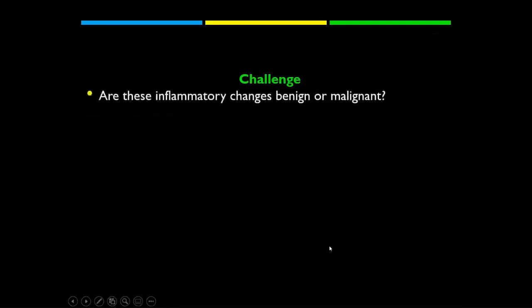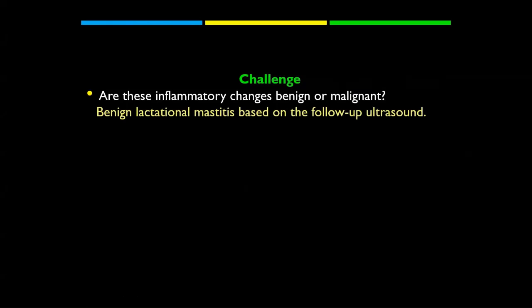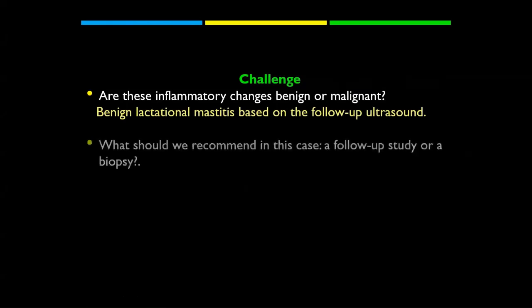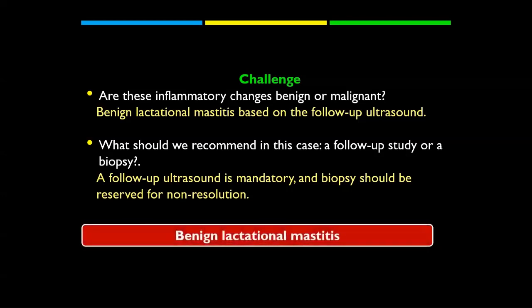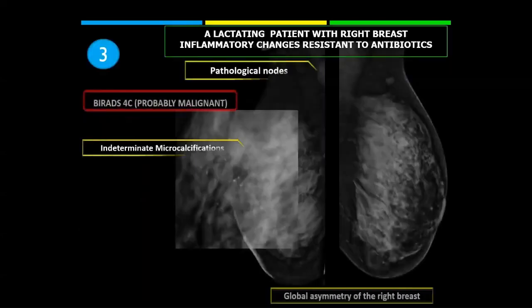So the challenges in this case, are these inflammatory changes benign or malignant? We cannot say based on the first examination. We can only confirm it is benign based on the follow-up ultrasound examination. And what should we recommend? As we said, we should give her a short course of antibiotics. Non-resolution after 10 days is an indication for biopsy. And this was a case of benign lactational mastitis.